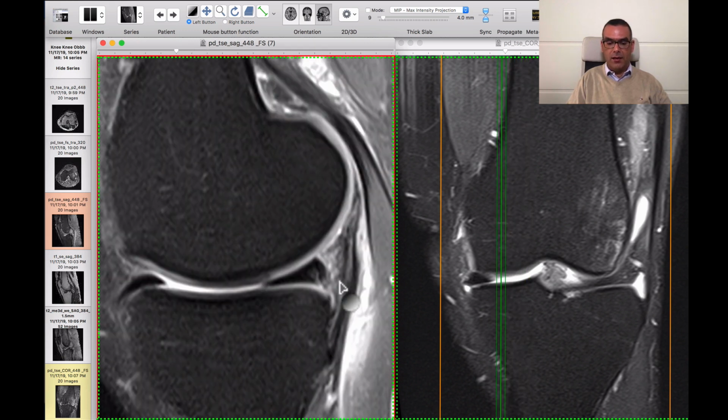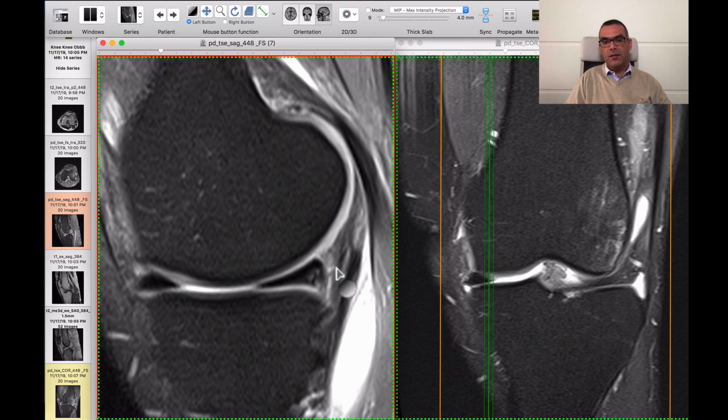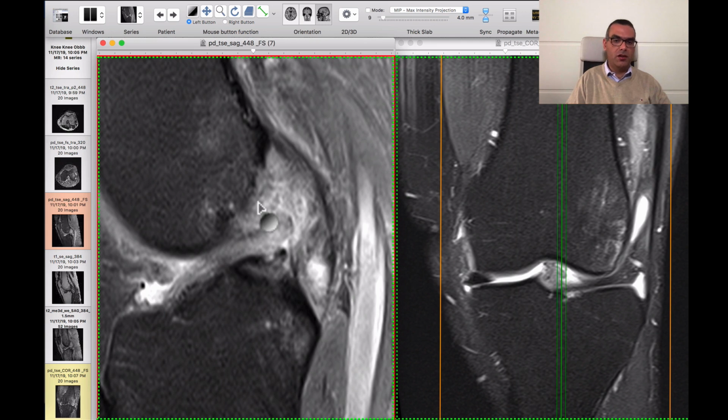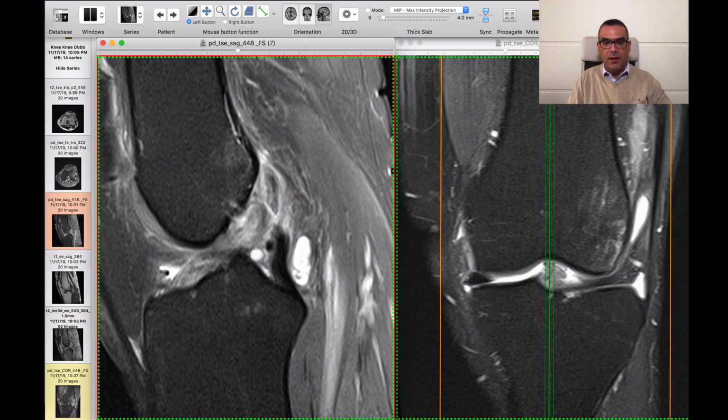And this, guys, is what you call a meniscal ramp lesion, and we explained this in the previous videos. So by the arthroscope, if the orthopedist goes this way and doesn't reach the apex of this ramp, he won't see this meniscocapsular injury, and it will be missed, the meniscus will be unstable, and the patient will continue to complain after managing the ACL tear. This is, of course, the ACL tear. It's crystal clear.